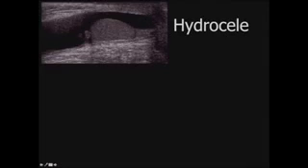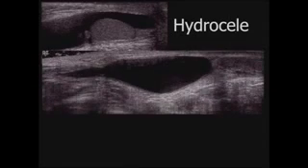So garden variety hydrocele, the patent processus vaginalis, you've all seen that. Fluid comes and surrounds the testis. Again, there's normal fixation of the testis against the scrotal wall. The encysted hydrocele, or funiculocele, some people call them, is really a loculated fluid within the inguinal canal. Testis is below, abdominal cavity is up above. These can often be mistaken for incarcerated hernias or even lipomas. Lipomas are very uncommon in pediatric population, whereas an encysted hydrocele is actually fairly common.